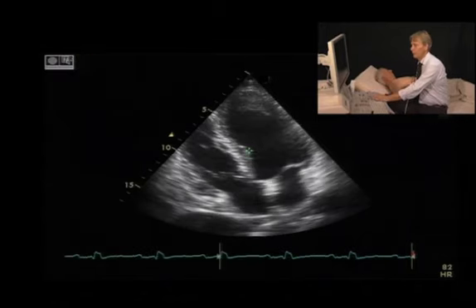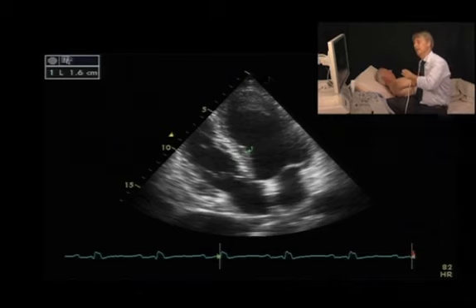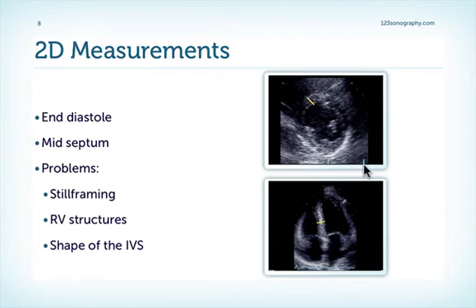Then I perform a measurement of the septum, which I would perform in a region of the septum located where you would also measure the M mode. So it's between the mitral valve and the papillary muscle. However, I would avoid measuring the maximal thickness if the patient has prominent mid-ventricular septal hypertrophy. So I would then measure somewhere below or above this region. Here are two examples where you can measure the septum in a short axis view and a four-chamber view.